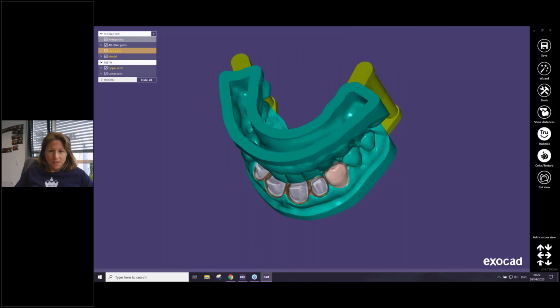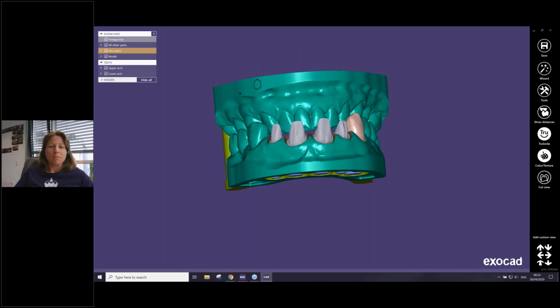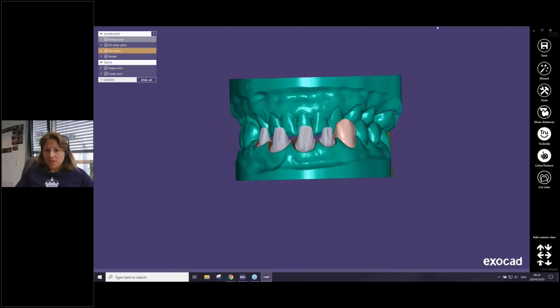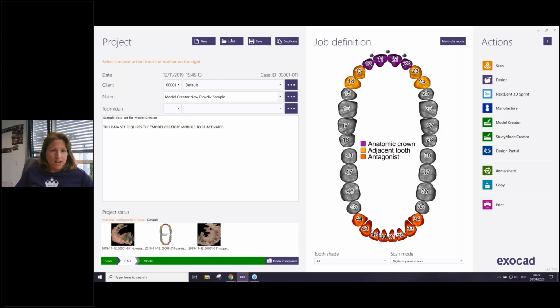No, okay. So this one I will show in the next one, in the implant model. Yeah, that's better to show. So, okay, here we will close this one. We don't save it. And we will start the second model type.